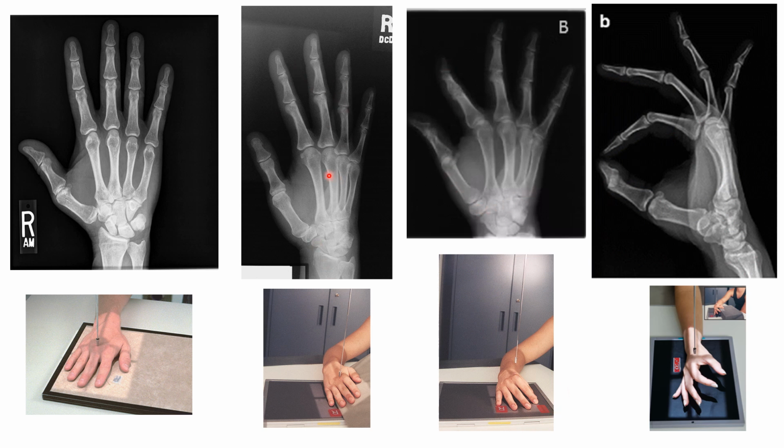So once again, the open joint spaces are about a perpendicular central ray being used, and the hand and the phalanges, the wrist, the forearm, all parallel with the IR. So body part placement along with central ray placement will show us a nice open joint space.